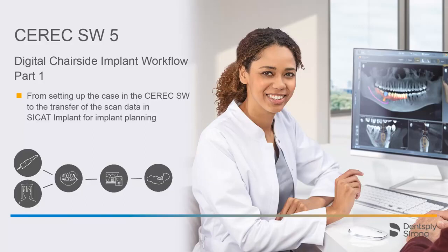This video is part 1 of a tutorial series. In this video, we focus on setting up the case in the CEREC software to the transfer of the scan data to the SICAT Implant software for implant planning.